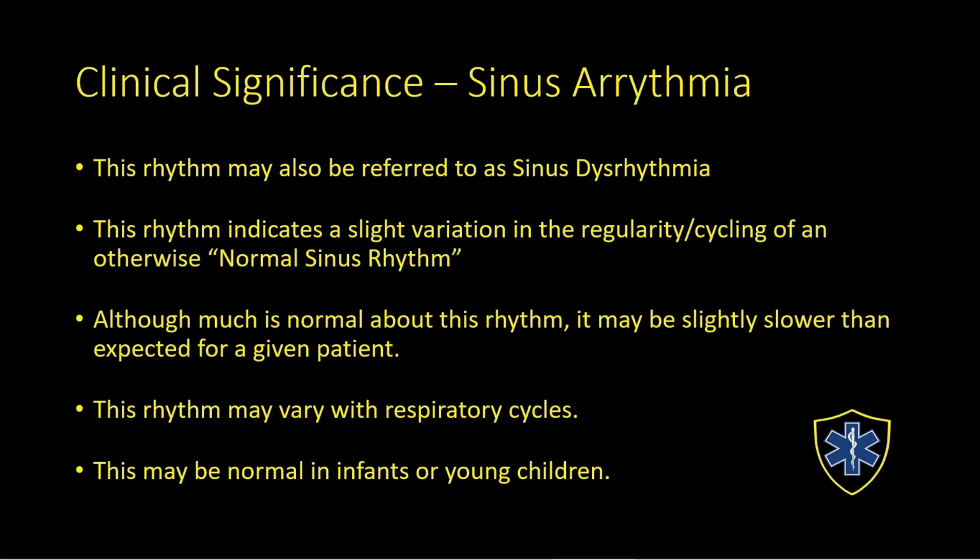Let's look at how the patient's presenting. Are they hypotensive or are they normotensive? Are they perfusing adequately? Is the heart doing its job? Okay, it's a little bit irregular, but is it doing its job? Is it perfusing the body? Do we have a good BP? Do we have good mental status? If we do, we can note that we have sinus arrhythmia or sinus dysrhythmia, but nothing clinically significant about the rhythm.